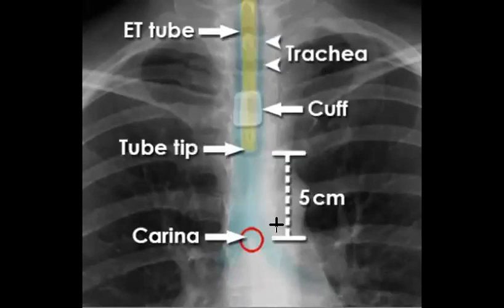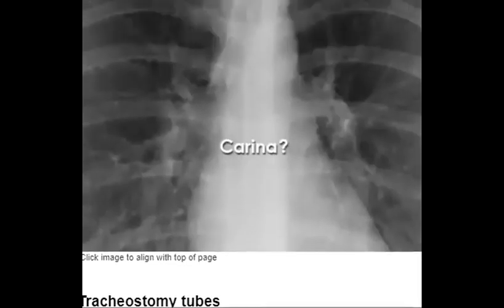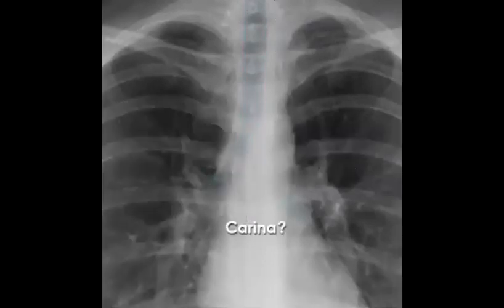The endotracheal tube, yes, is in good position. Why? Because you expect the carina level in an adult to be about 5 centimeters and in pediatrics about 2 centimeters, right? So you will check the position in this patient. How do you find the carina? This is a good question. Sometimes you can find the carina easily, sometimes not.